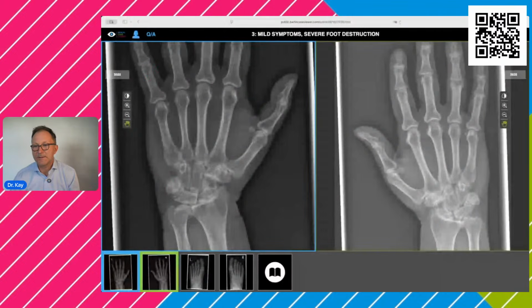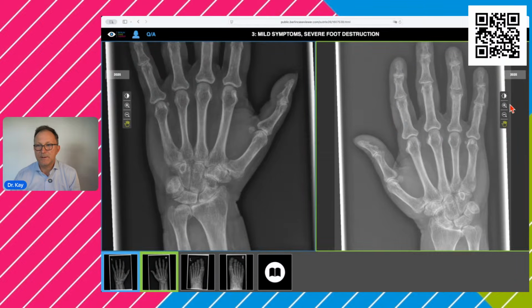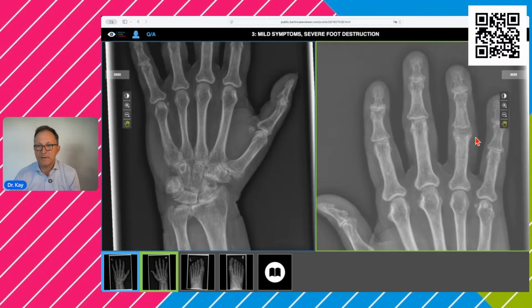Please, Imane, Yasemin, try to analyze these images. I will start screen sharing again. So here's the screen. Here's the screen. And it's even better to be seen if you log in. Okay, so what's about the PIP on this fourth? Wait, is there something strange here at the PIP on the right side?